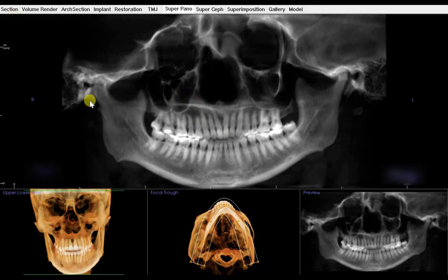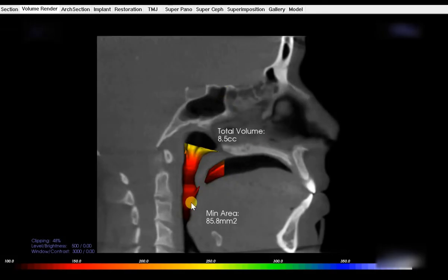of mucosal thickening, calcified stylohyoid ligament, and then there was the reduced pharyngeal airspace because of the retruded soft palate or the tongue mass. So certainly that could be a case of sleep apnea and need further review to establish whether the patient is actually a case of OSA or not.